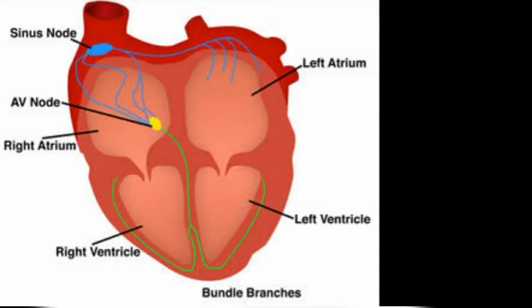An electrical impulse from the SA node has to travel through the atria to the AV node and down the His-Purkinje system to reach the ventricles and create a ventricular contraction. This process is reflected on ECG as the PR interval, which leads to a QRS complex. A delay in conduction in this system results in an atrioventricular conduction block, or AV block, or simply heart block.